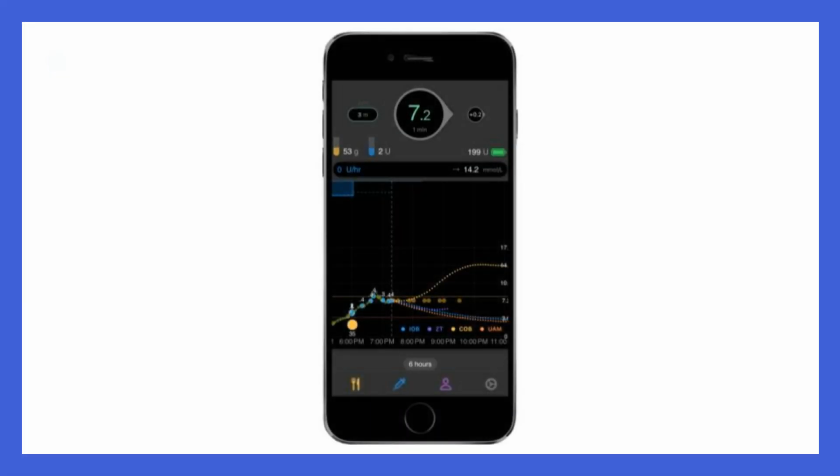In the middle of the iAPS home screen, you can see your basal insulin delivery in blue. The horizontal dashed line is your preset basal insulin rate. Below that, you can see your glucose curve. The curve left of the dashed line shows your recent glucose readings. Orange circles are entered carbs, and blue arrow circles are insulin boluses. The curves right of the dashed line show the different predictions for your glucose. There is a legend for these prediction lines below the curve.